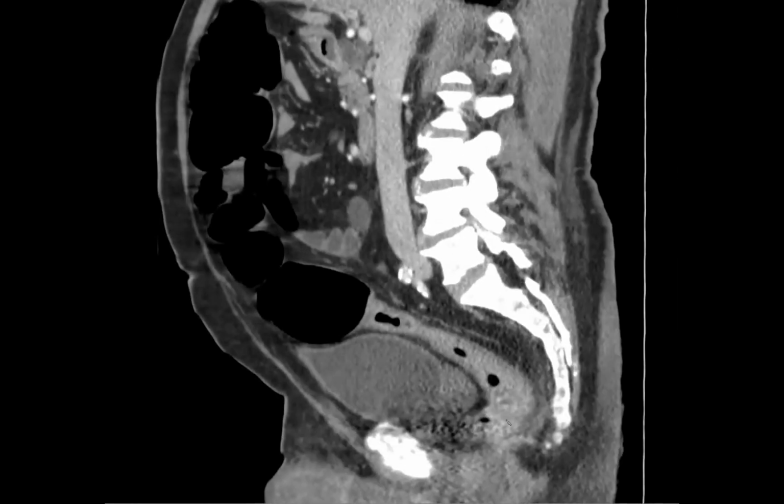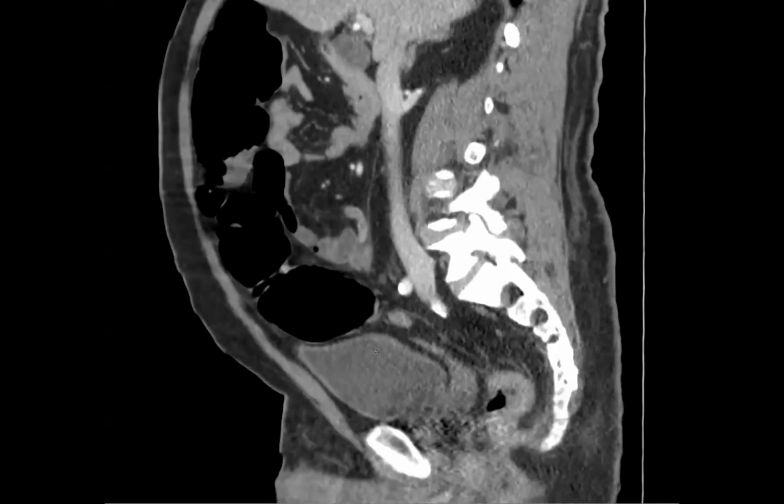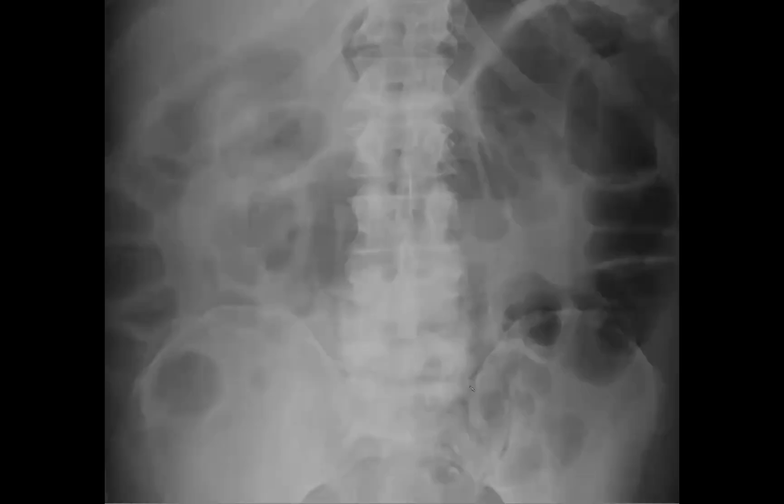So this was just a good case of a fake out. We were concerned about this transition. There was upstream dilation. We brought up, could there be an obstructing mass here? It looks a little shouldered. And we recommended a colonoscopy. And the surgeon said, if there's an obstructing mass, we don't want to do a colonoscopy because we don't want to insufflate the colon and perforate it. The other thing you can do is what they called a GGE.